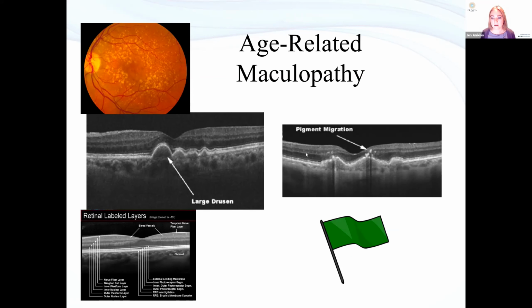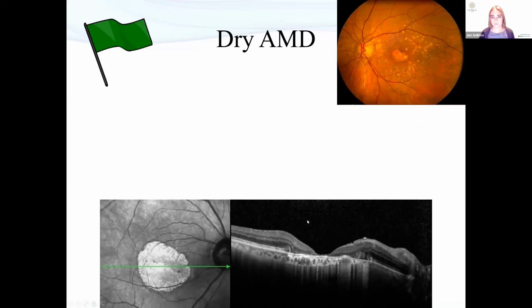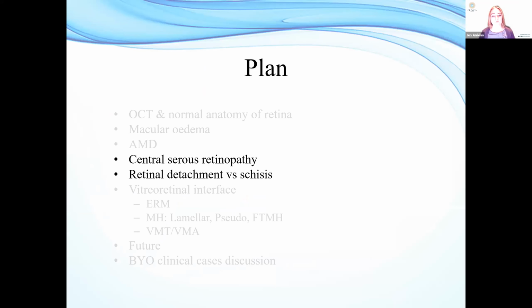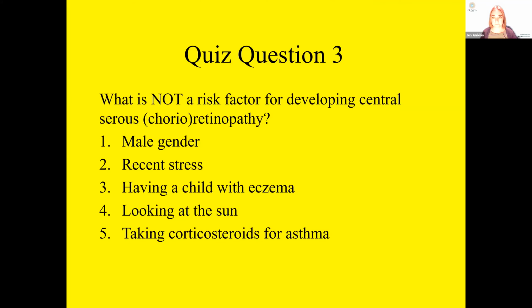That's fine. Okay, so we were up to burnt out. Good. And we were moving on to the CSRs and my favorite retinal detachments. Now, there's not very much to say about these on OCT. They look pretty exciting, but you usually don't need an OCT to diagnose them. We're just going to do another poll to liven things up.